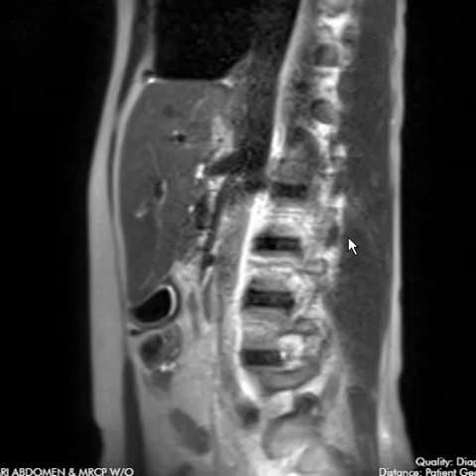The proximal duodenum was not dilated. Sometimes patients can have dilatation. If you have that, then you can be really confident. So in this case, we could do a GI exam to see this cutoff sign. You get a vertical band cutoff as it courses over here. That may be able to help cinch the diagnosis.